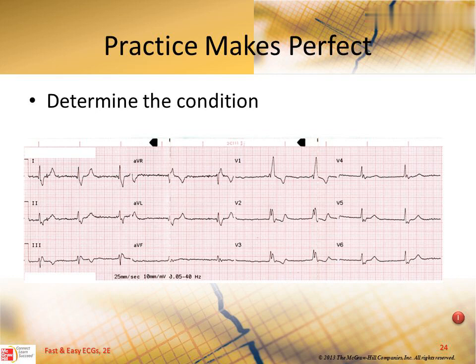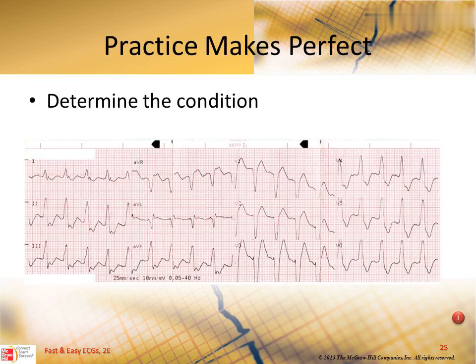Practice makes perfect. Determine the condition. Junctional escape rhythm with right bundle branch block. Practice makes perfect. Determine the condition. Answer: sinus tachycardia with left bundle branch block.